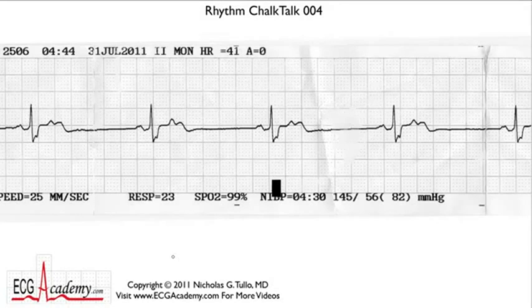The last one was really tough, and I know a lot of you may not have gotten it right away. But remember, Chalk Talks assume you know the basics. What I'm trying to do is get you used to reading more difficult tracings. This one won't be as bad.